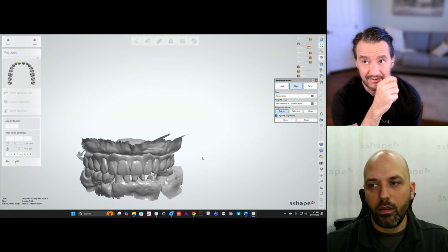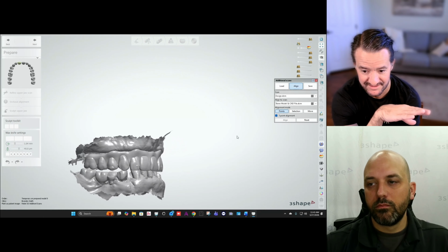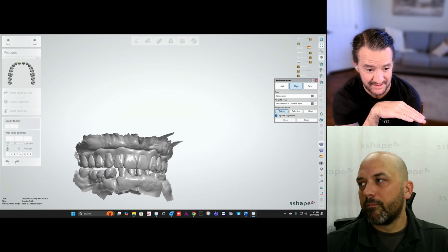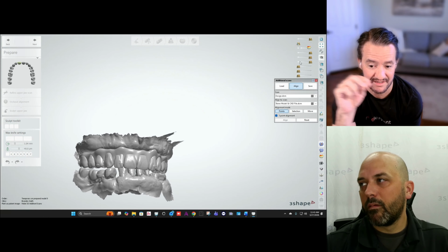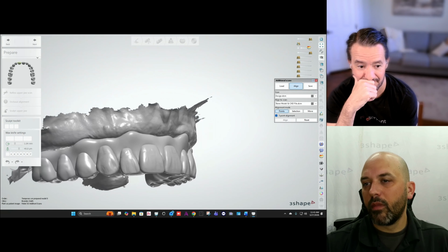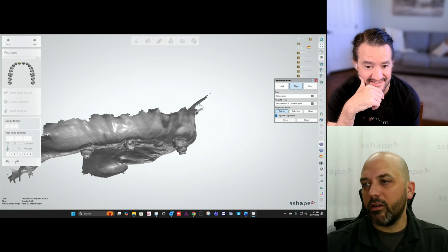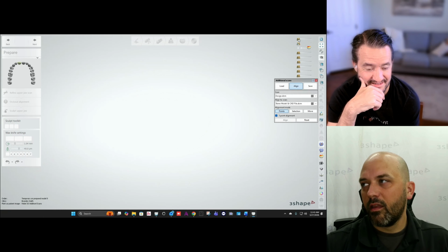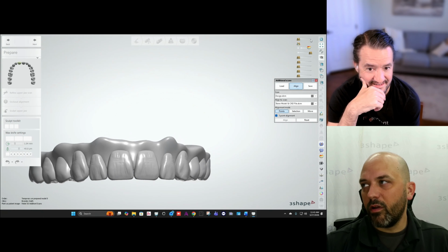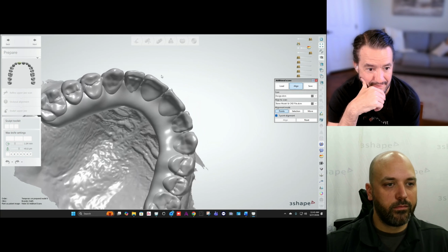Taking the design, show the design from the stone model. That's the design that you originally liked, the doctor liked, that didn't fit in the mouth. And then now show it aligned to the intraoral scan, because that's really the payoff of what this was all about. So here's the intraoral scan, and here is the design file. So it is now aligned to my intraoral scan.